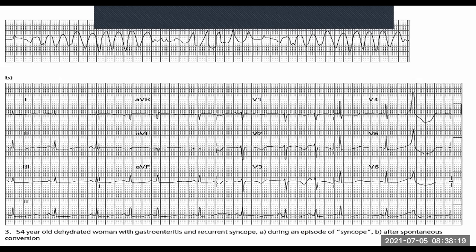And then the last one that we look at is AVR. AVR is looking at the right side of the heart. It's often called the forgotten lead because it only looks at the heart from one particular side. Last week we were talking about AVR and overdoses on Friday. Because we had already seen a prolonged QT, we would look more closely at AVR to see if there's something to suggest that. But in this case, there isn't. But the one thing we pick up is this prolonged QT.